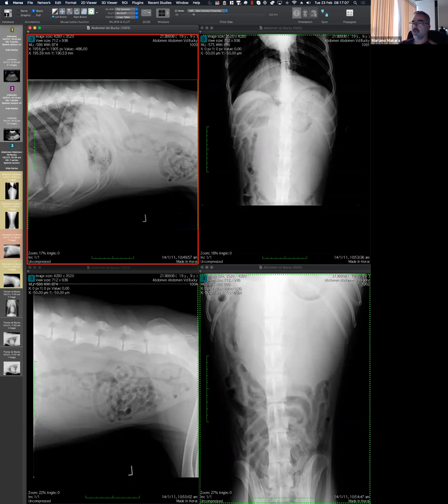I would personally probably add one more thing, and I know that I sound like a broken record about this. Is the stomach? The stomach is a very good telltale because it's basically telling us a very nice story. So the stomach is not caudally displaced.